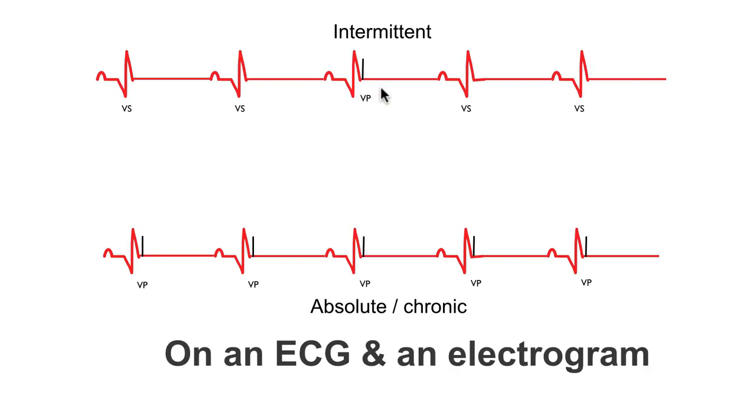This is like a flushing toilet. Once you've flushed the toilet, you have to wait again before the toilet is ready to flush once more. And it's the same with cardiac tissue. So here, although it's tried, the tissue is not ready, and so it doesn't trigger a ventricular depolarization. Normal service is resumed on these next two heartbeats, so we can say that this is intermittent undersensing.